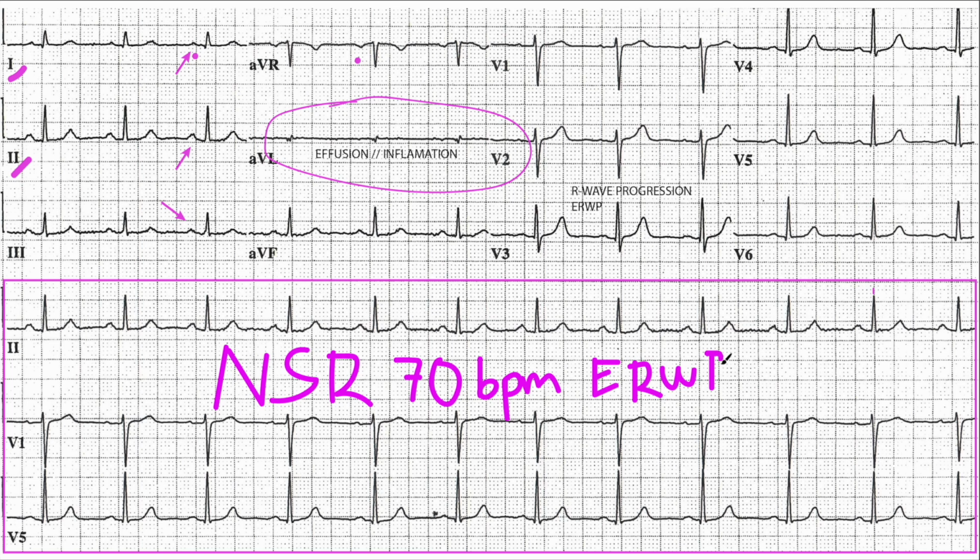When you say that there's an issue with AVL and it's not of mechanical nature, a red flag goes up. So far we have two red flags on normal sinus rhythm at 70 beats per minute. And you have a borderline first degree AV block. Now, this is a yellow flag.